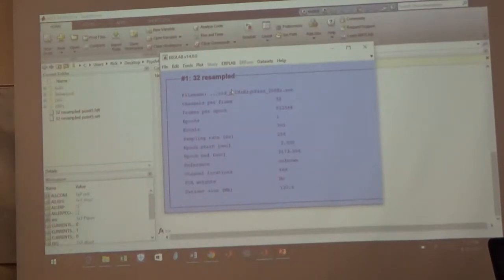So this is our sequence. Right? 1, 2, 3, 4, what do we do after we loaded the data? It's this first thing that we just did to the data. The location. Yeah, we wanted to basically add channel locations. So this is the next thing we did. So add channel locations. And we did that by virtue of within scripts, folder, it was within channel locations, and we actually had it so that the file was 40 electrodes dot CED. Okay, so that was our fifth.